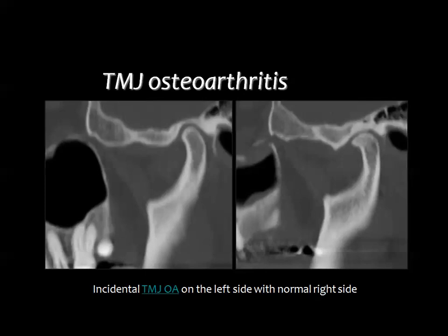In the previous days, we used to have the conventional X-rays and the conventional tomography for the temporomandibular joint, but now we may have the help of the mandibular panorama, or also you can use the cone beam CT, or also the multi-detector CT with reconstructed images for the region of the temporomandibular joint. This is the normal joint where you can see the mandibular head and the temporal eminence with smooth articular surfaces and maintained joint space.